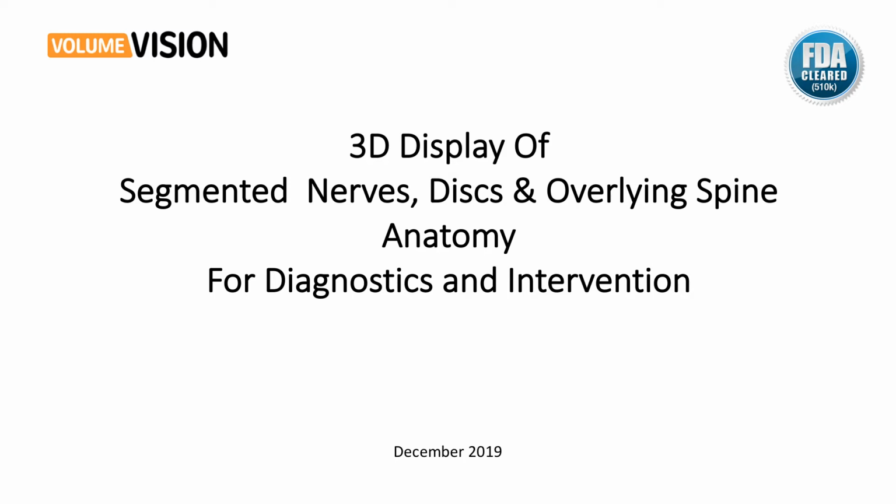What follows is a presentation of images showing both our proposed software platform for degenerative disc disease and CARDISTEM, and some other utilities and platforms that we've developed independently. We were introduced to Xemina through Siemens Healthineers, as we have developed technology that can take standard two-dimensional MRI images, turn them into three-dimensional displays to show specific anatomy that can't be seen from simple MRI scans. This is called segmentation and volume rendering.